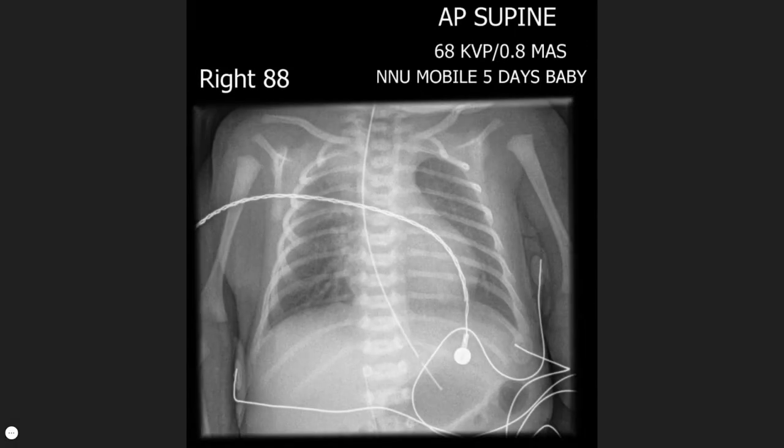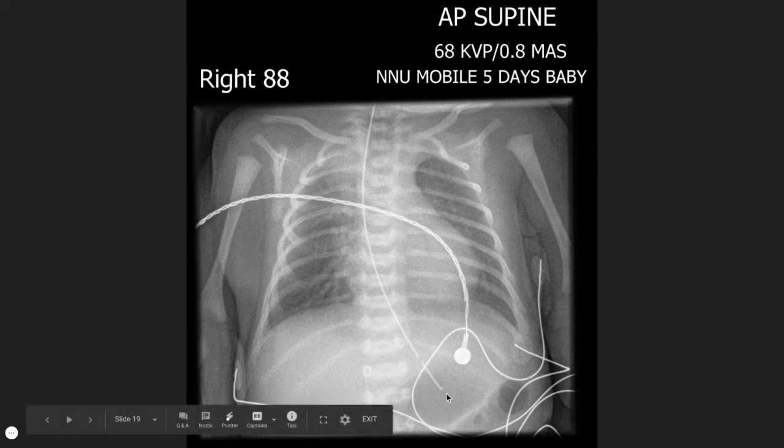In this example, we are back to a paediatric patient. The tip of the nasogastric tube is clearly within the stomach bubble, but one of the side holes of the tube is projected over the distal esophagus. The tube should be advanced further to reduce the risk of reflux of feed into the patient's lungs. There is also some right upper zone opacity suggestive of infection.